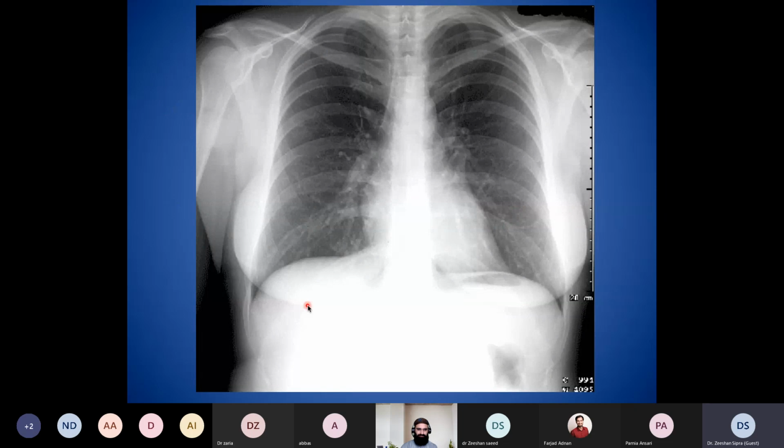Inspiration. This is the first image you are looking at. It's a normal chest radiograph. It is for you to understand what is full inspiration. Basically, the shadows over here are depicting the anatomy that is overlying the chest. For inspiration purposes, I'm starting with the anatomy of the ribs. I hope you can appreciate these are the ribs. But most importantly, the radiologist is not counting this posterior part of the rib.